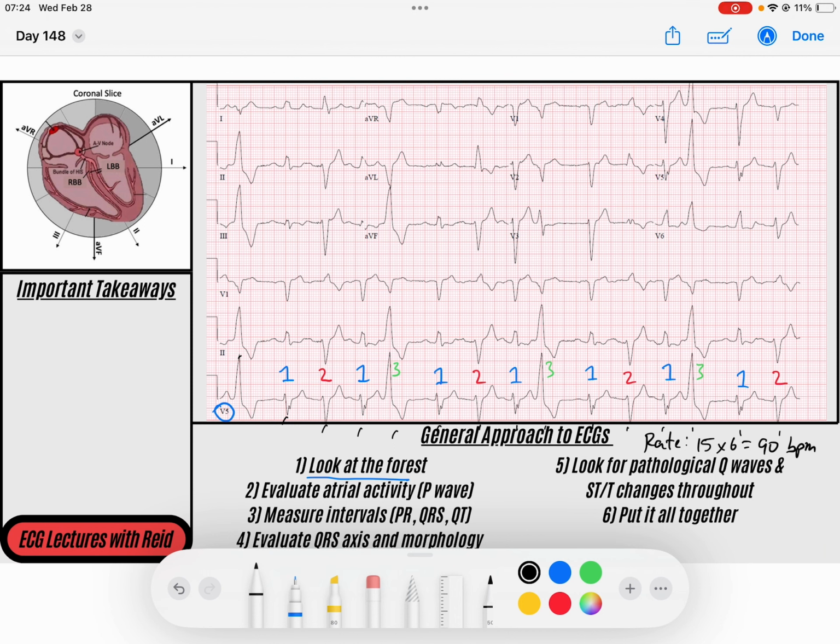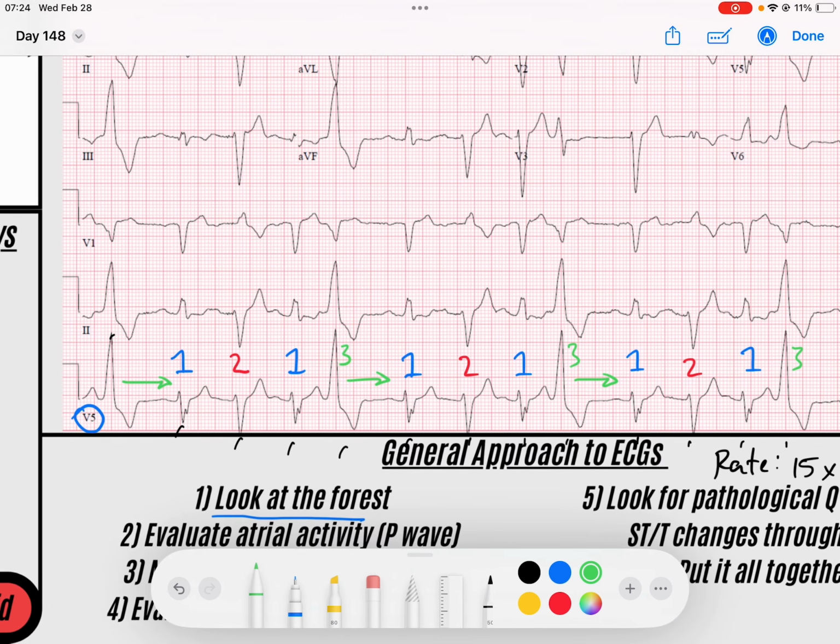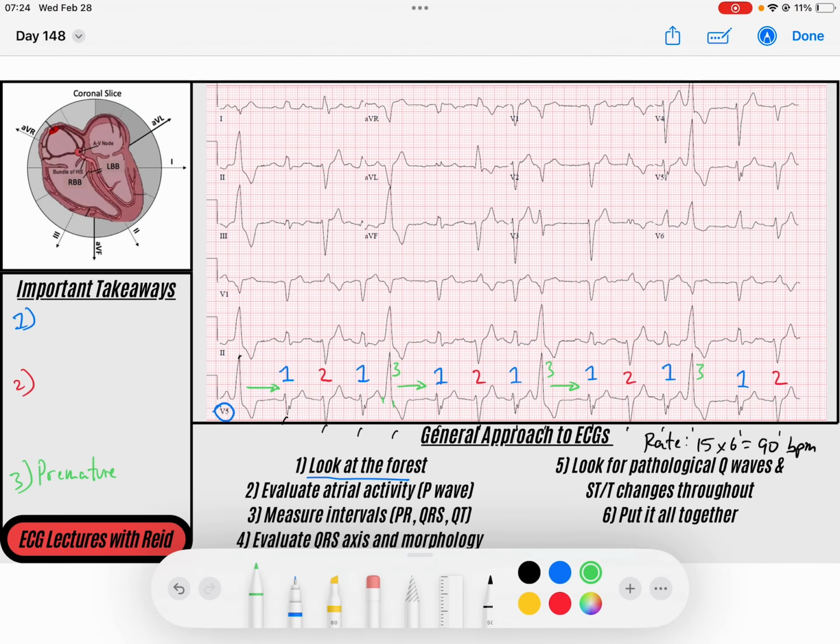And so I'm going to glance in front of these QRSs. What is my thought here? I'm going to label these over here, and we're just going to put some data points about each of them to try to help figure out what's going on. I know that number 3 comes premature. It's a premature beat, and there's a little bit of a pause after. You can see that pause. It's wide complex, but my baseline beats are all wide as well. These are all wide, and 3 is premature and wide.